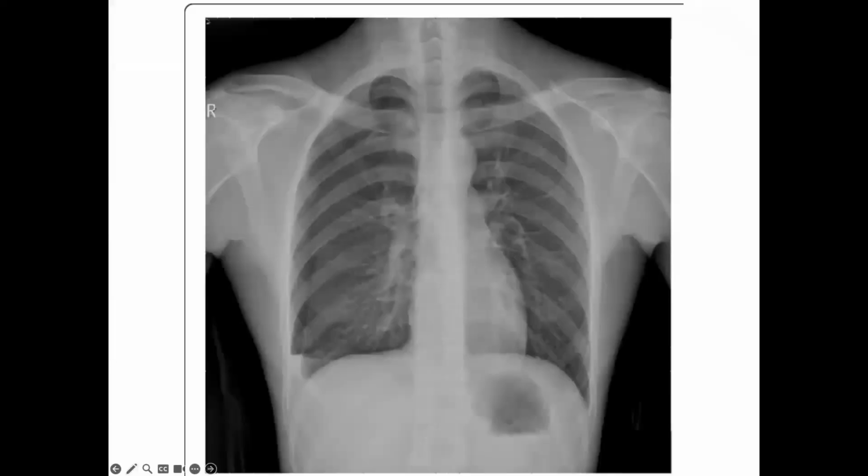Okay, we're almost there. So this is a very unusual case to end things off today, and we'll take some questions. A very unusual case of what's known as primary spontaneous hemopneumothorax in a young man with atypical tension pneumothorax. It's a case report, so you don't see it every day. And look, I hope you never see it. It's very odd. It's a really discrete marking here that lets us know there's a pneumothorax.